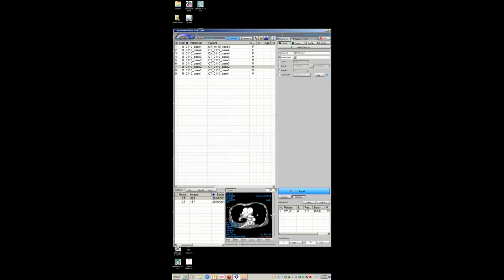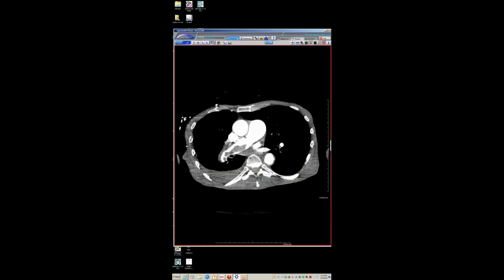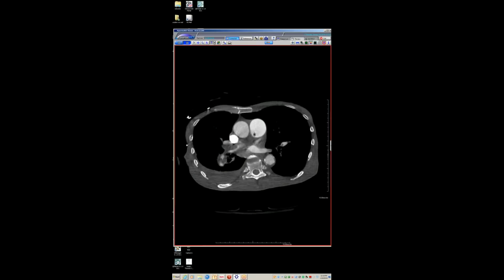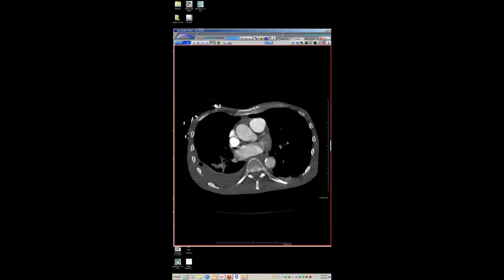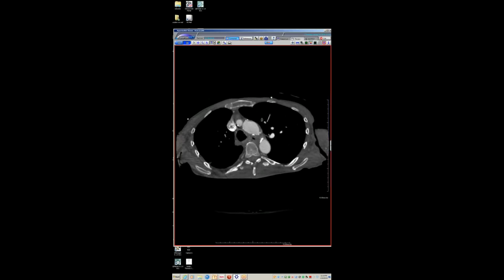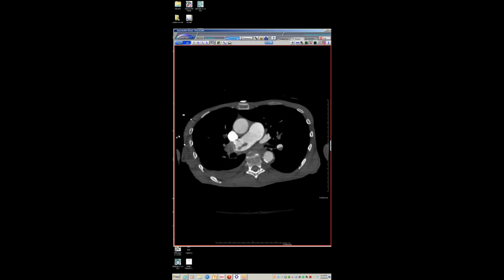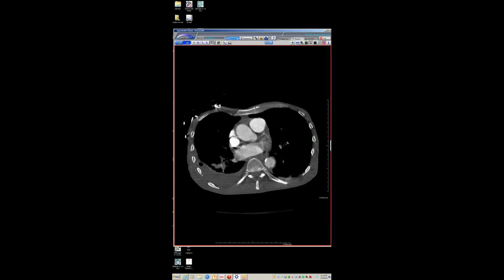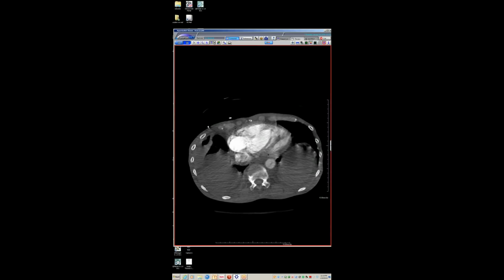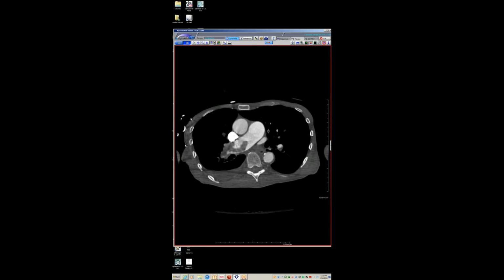This case, what was this case? Oh, yeah. I don't know if I showed this case. I was looking through, doing this research project on aorta. We have about 30 aortic sarcomas here. So anyways, this is not an aortic sarcoma. But I was looking up old cases of PEs, and this patient clearly has a large PE, and there's severe right heart strain.